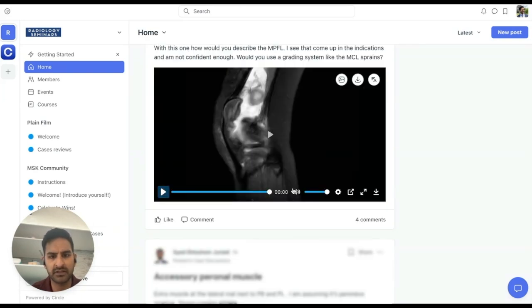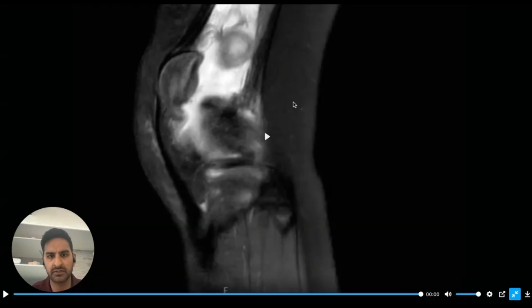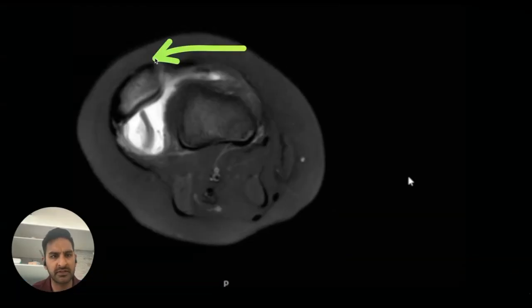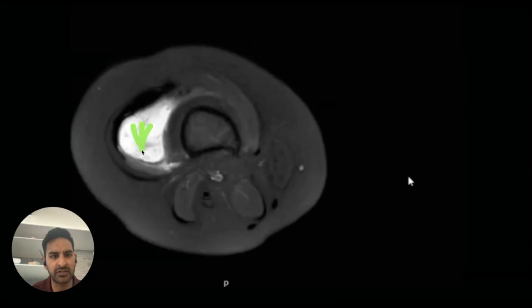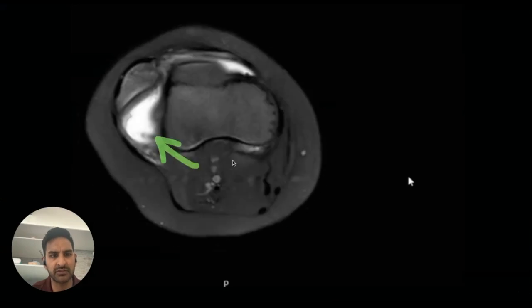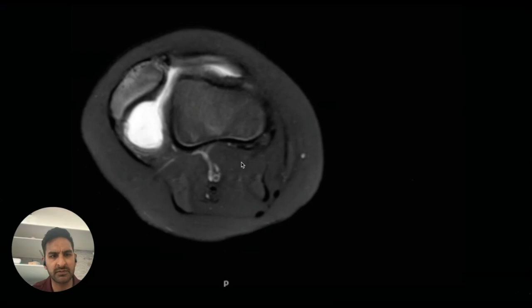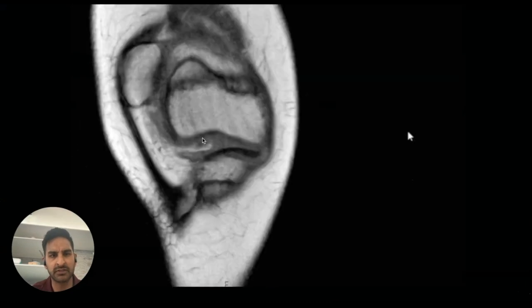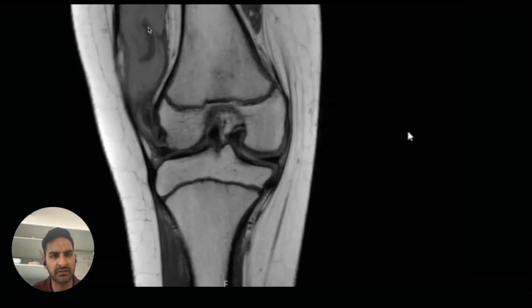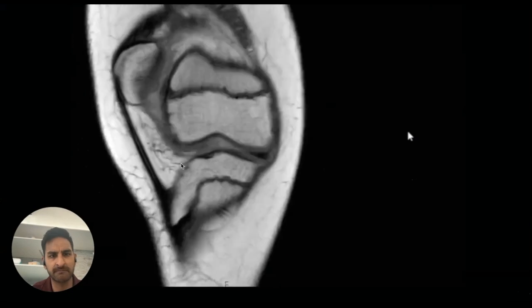Okay, so this next case looks like a video. So we'll just full screen it and see what's happening. So yeah, we can see that the patella is very laterally placed. There's a bit of a chunk of patella that's sitting over there as well. Can you see that? So there's a bit of a chunk of fractured chondral surface there. It's probably come off the patella, big joint effusion. Quite a young patient. You can see a few growth plates. There's that chunk of patella that's sitting up at the top there.